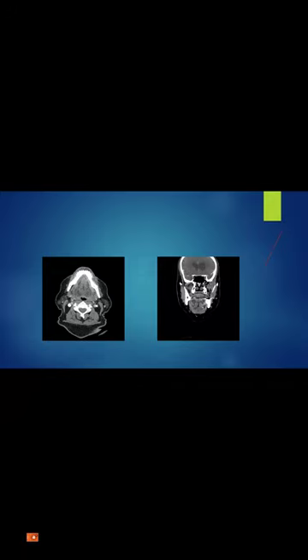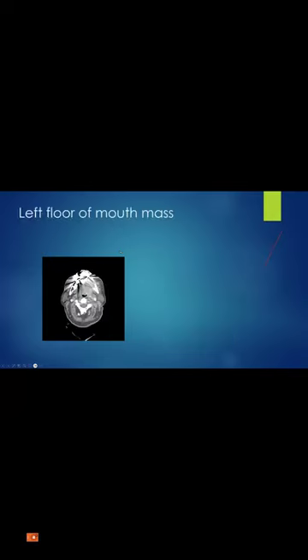Say it again. Left. Malignant looking lesion related to the left aspect of the mandibular body. Yes, that's true. And also this abnormal enhancement as well. Yes. Extension which can be seen here. Okay, this is a left floor of the mouth mass.